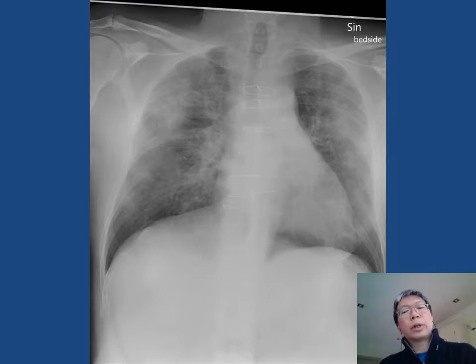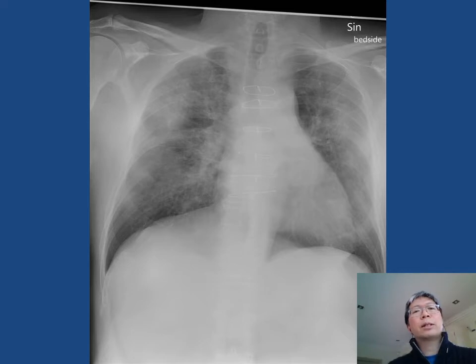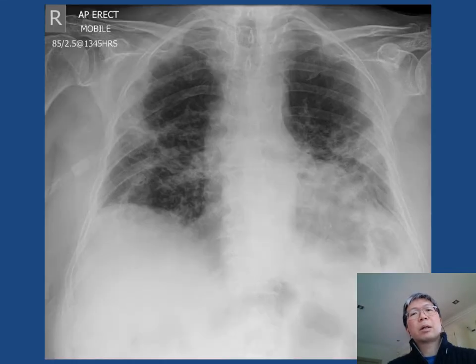This is a good example of a patient who presents with diffuse airspace opacification in the right upper zone, as well as some minor changes on the left. Here, you will see a confirmed COVID-19 patient demonstrating patchy consolidation in the right midzone. There is also change on the left midzone, and there is clear consolidation in the left lower lobe as the left hemidiaphragm is completely obscured.